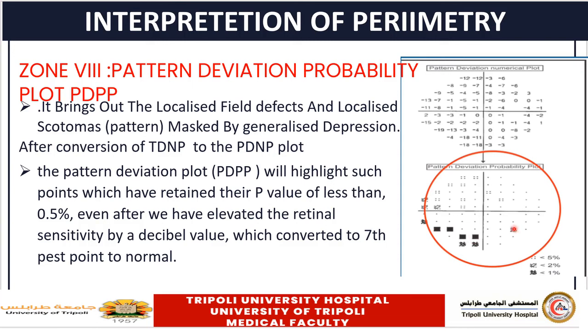Now you will read the figure corresponding to each scotoma here, and accordingly you will determine whether your patient is normal or abnormal.